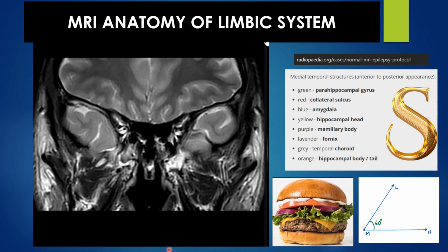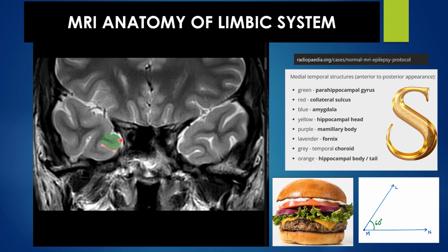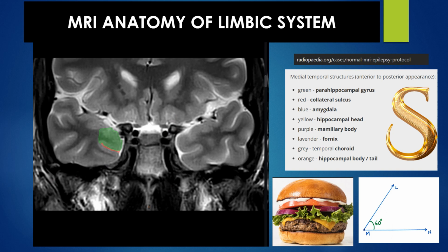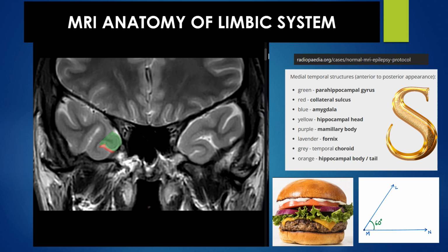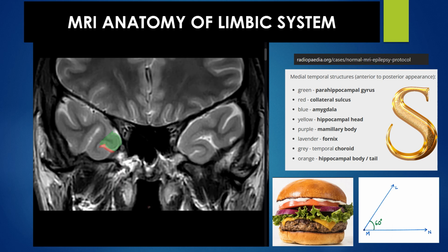So now let us move on to how this looks when we scroll it actually. So we are going to move from anterior to posterior. Let me stop and explain. This is the most anterior location. So this line, this cleft which you are able to see, right?